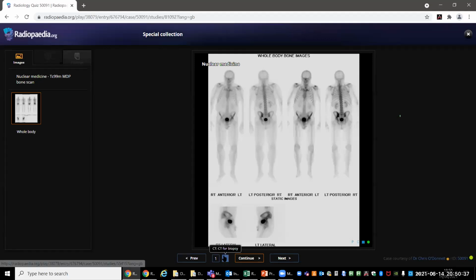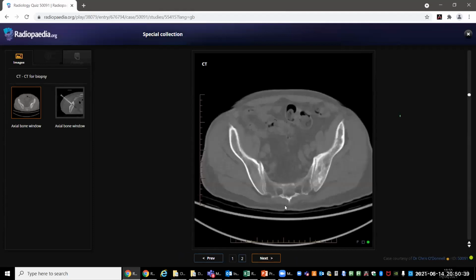So the CT was actually the giveaway, but I don't know, you got distracted by the history. Yeah, you're absolutely right. So it's actually diffusely involving the bone. It's mildly expansile. It's coarse. It's mildly thickened. At least the medullary cavity we can clearly see the difference. So this is actually Paget's.